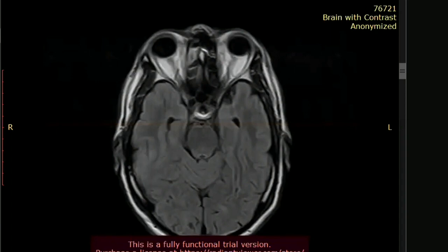Ma'am, I would like a GRE image for the hemorrhage. Yes, definitely, you can ask for GRE. I'm sorry, I don't have GRE at present.